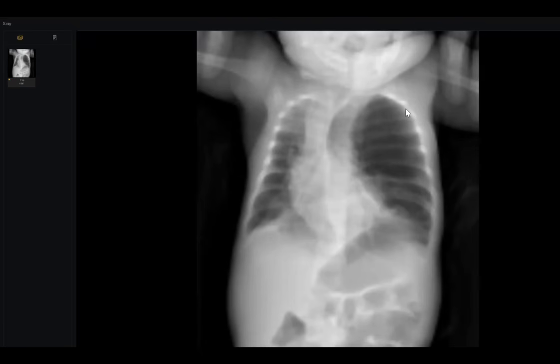Yes. Doctor, could you tell me, is this lobar hyperinflation or whole lung? How could you differentiate radiologically? Sir, in lobar hyperinflation, mostly it is the left upper lobe. I will check the markings in the left lower zone. Maybe some compression atelectatic changes which involve the lower zone, and it will be entire lobe involvement. Excellent. Thank you, Doctor. Brilliant. I am asking all the possible questions.